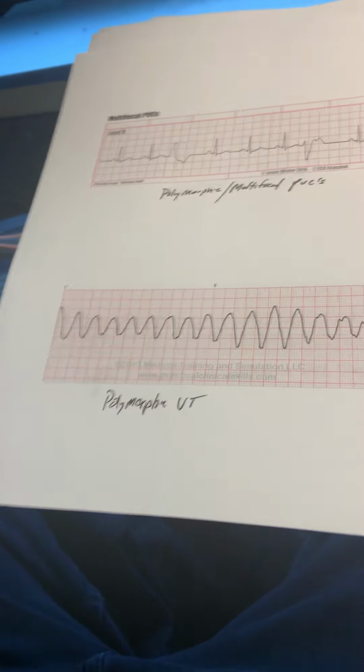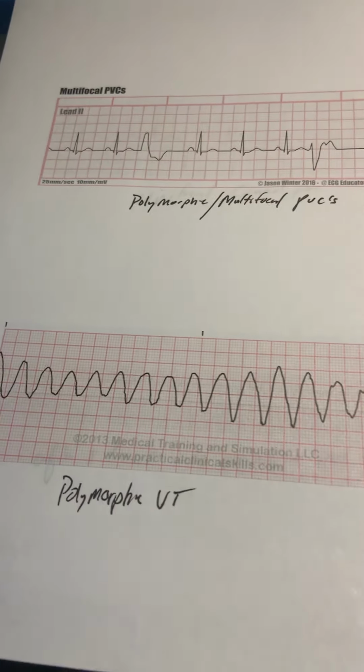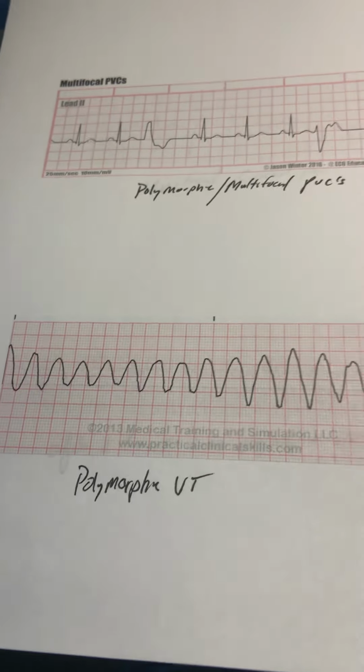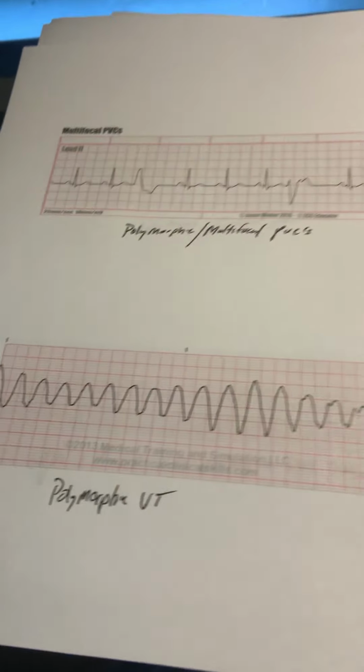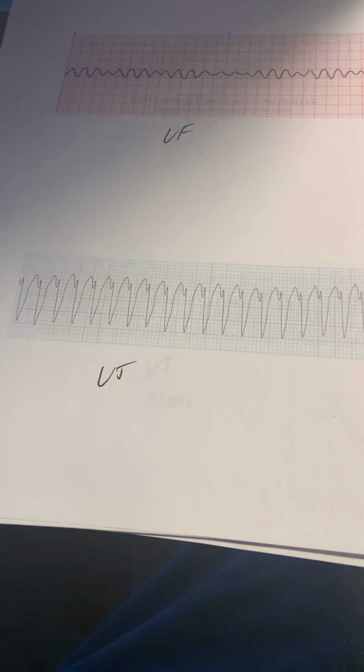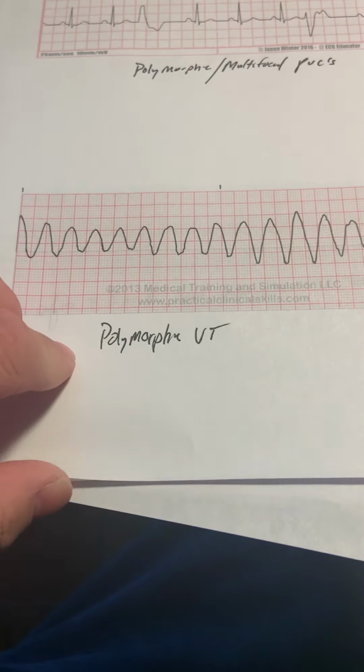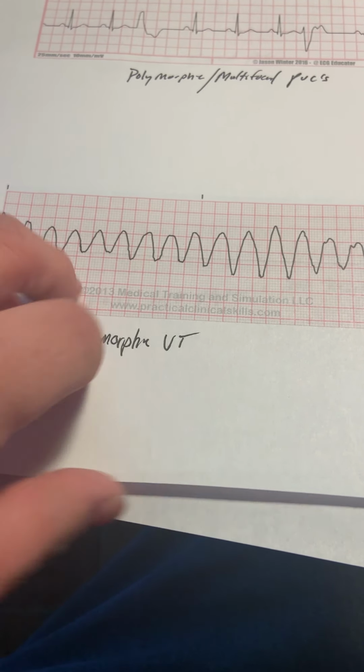Now, polymorphic ventricular tachycardia. Okay. So most of us are used to seeing VTach. Hold on. Gotta find it. Look like that. Okay. This is also VTach.